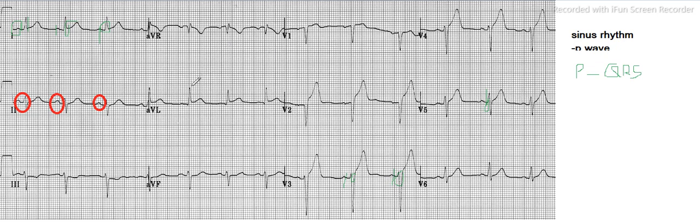And another thing we can look for is whether the PR interval is constant or not. So we'll be looking at that. Here you see about two small square boxes. So the PR segment seems equal, and the PR interval also seems equal.